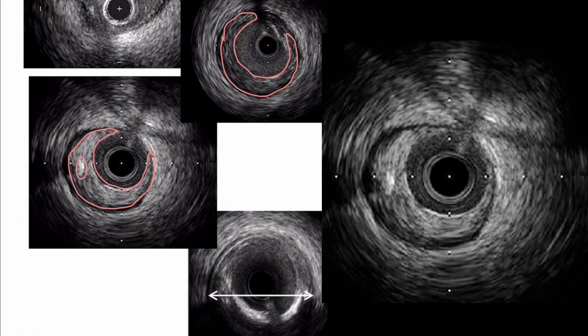So this is actually inside of this plaque, so it's probably a calcium deposit, which is why you see black shadowing behind it. That's a classic sign of calcium on IVUS. And I'll just circle that. So that's a deposit, and then this is acoustic shadowing that's inside of the plaque. This is wire artifact because it comes all the way up to the catheter.